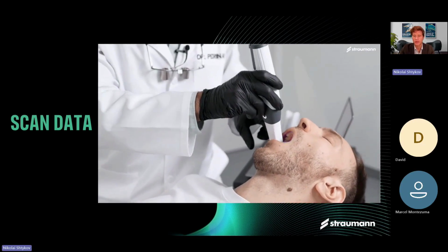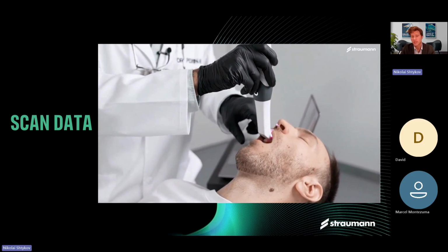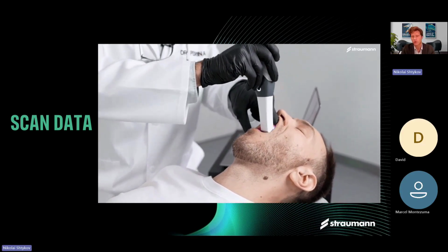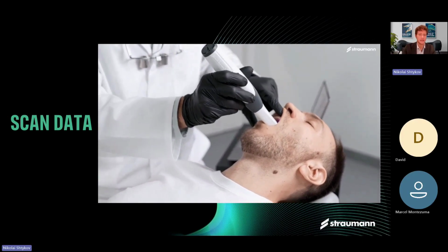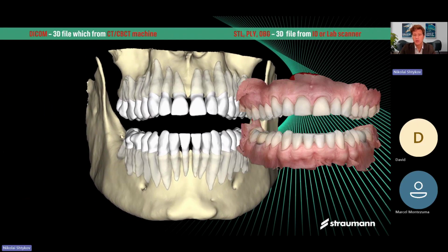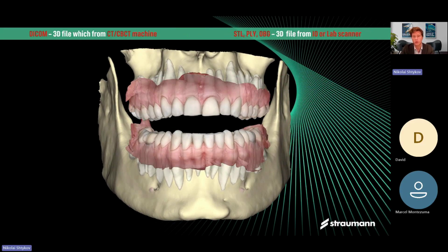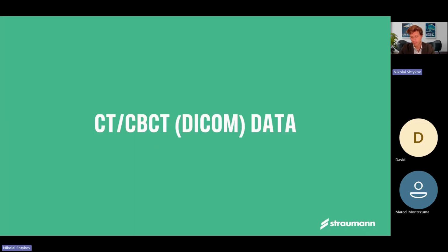DICOM data we get from the CBCT or CT device, and scan data we can get from the intraoral scanner or from an impression and a scan of the impression. Then we need to align this data in coDiagnostiX, and you can see that we will do this automatically. You will see in the program how we perform this.